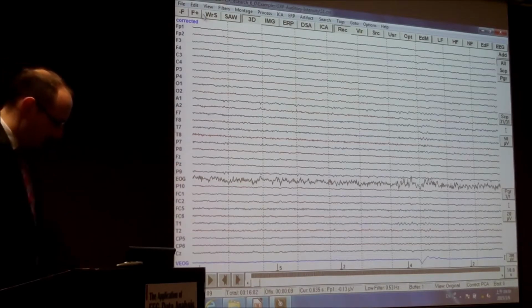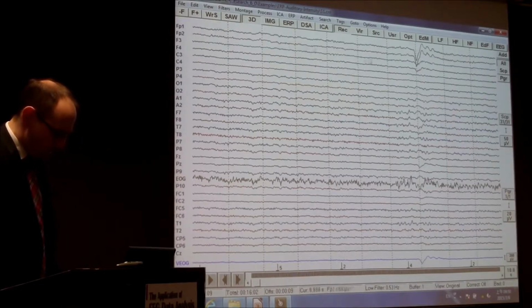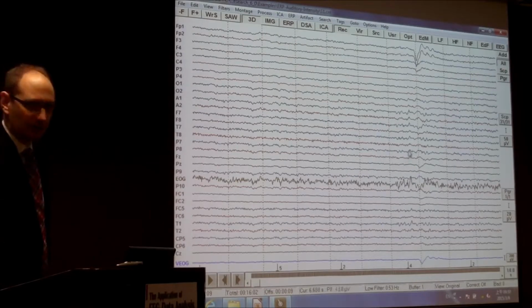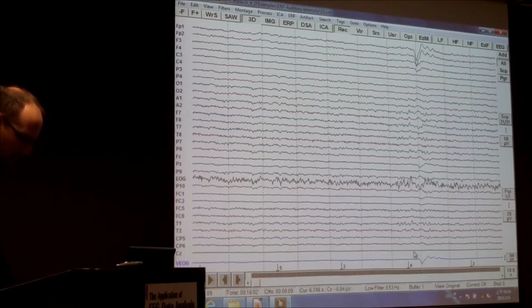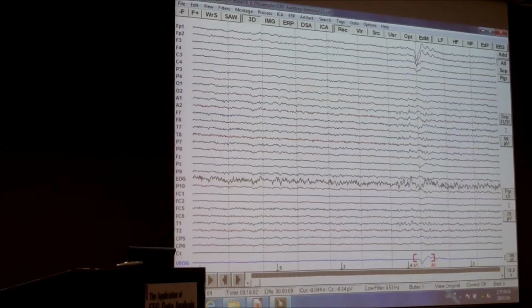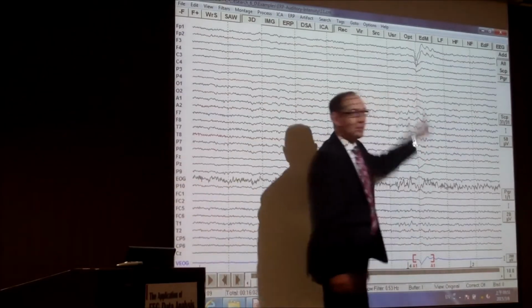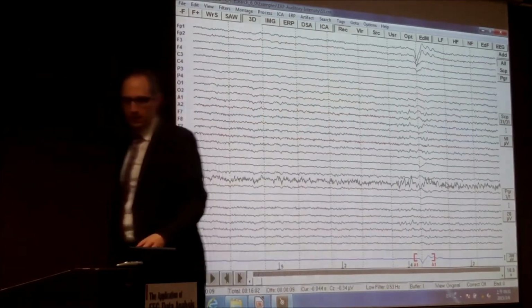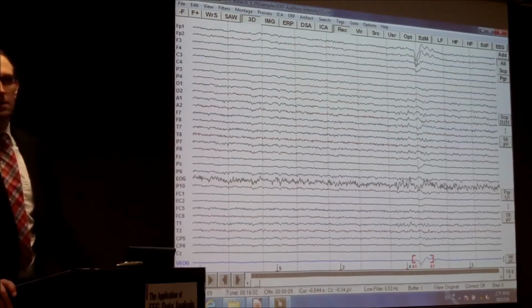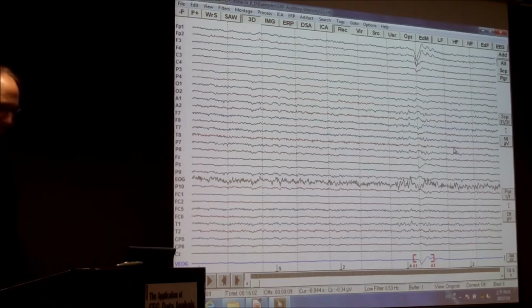Okay. And there's certainly another way to do artifact correction, by just excluding the artifact. That's not correction, that's rejection in fact. I just drag a block here and I define this artifact, and then all of the data from that block will be cut out of the data and you will not use it for analysis anymore. So it's rejected, not corrected. That's the difference. Okay.